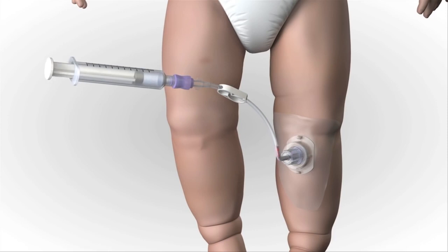Inability to withdraw aspirate blood from the catheter hub does not mean the insertion was unsuccessful. Consider attempting to aspirate after the flush. Site placement can also be confirmed by ability to administer pressurized fluids and noting the pharmacologic effects of medication administration after flow is established. Flush the catheter with 2 to 5 milliliters of normal saline.